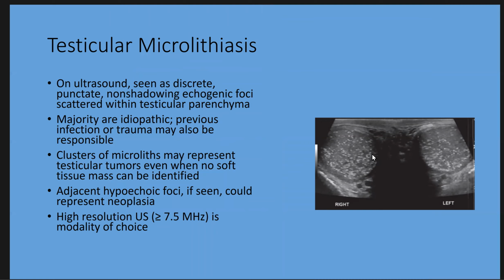High-frequency ultrasound transducer is the modality of choice, more than 7.5 megahertz. There is controversy about the presence of microlithiasis alone. If there is any other risk factor, follow-up is advisable. If there is no risk factor, there is no need to follow up.